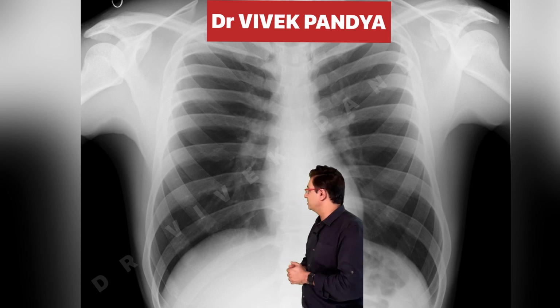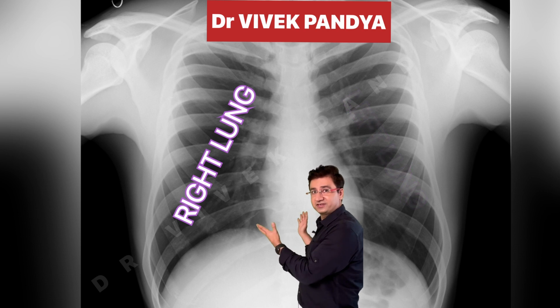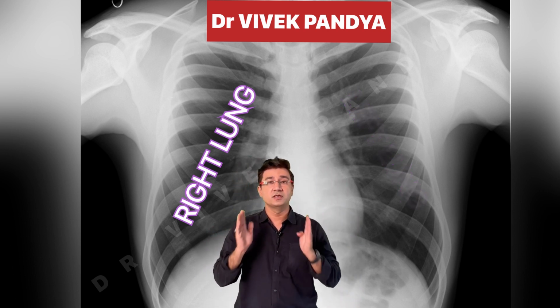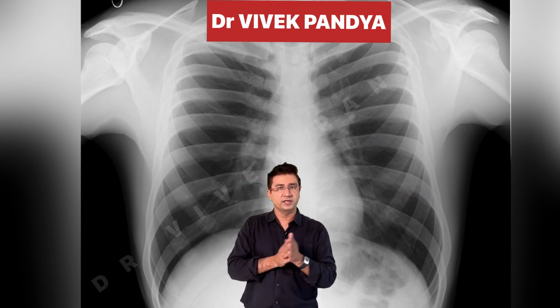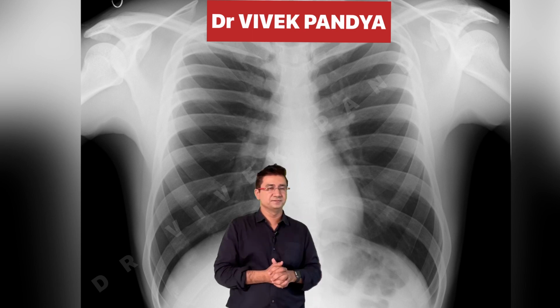Okay, then the next structures are the obvious big two lungs on either side. Lungs appear black. Black is radiolucent, white is radio-opaque. Fluid-containing structures, in contrast to air-containing structures, appear white.